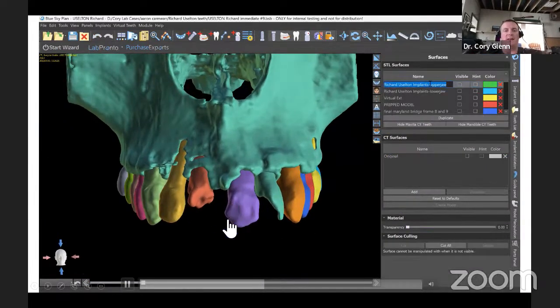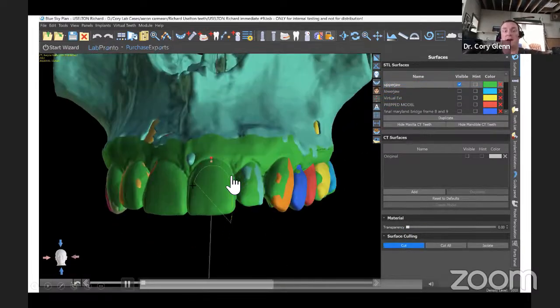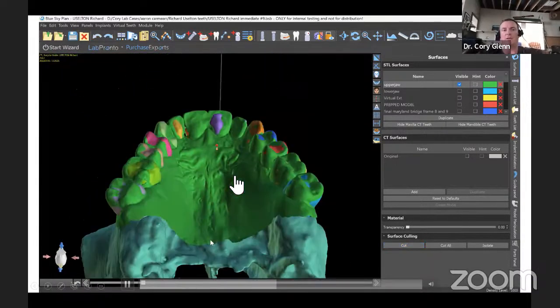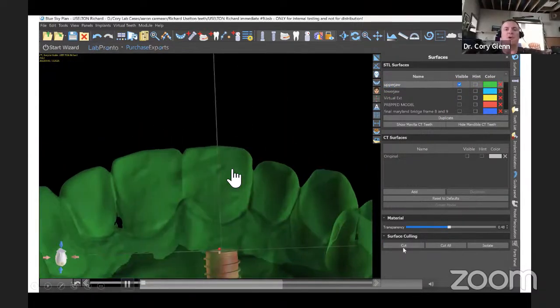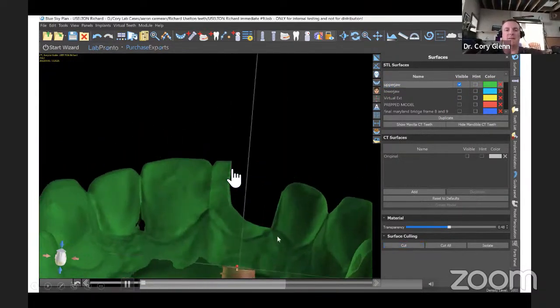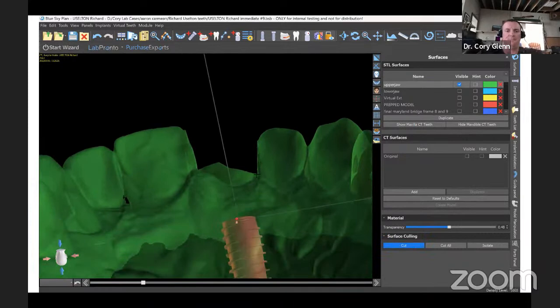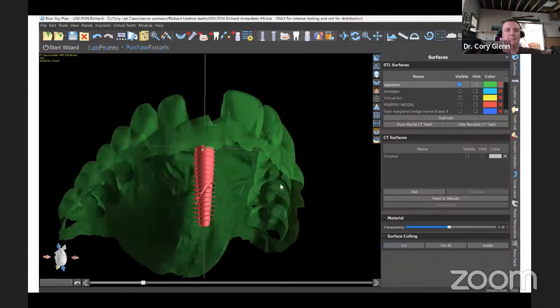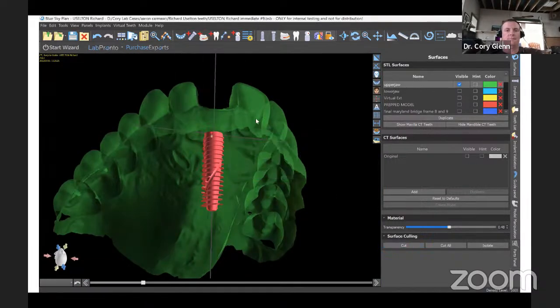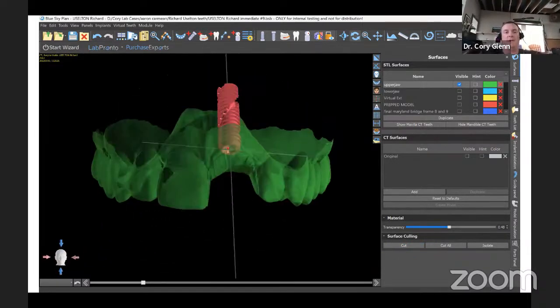Now going back again, on teeth that have restorations, you're going to notice that the scatter makes it not do the crown entirely right. However, usually it's going to get the root perfectly correct because the root's down below the level of that scatter. So since we are doing an immediate implant here, you can see I'm taking my intraoral scan, and I'm going ahead and just cutting out the majority of that crown.